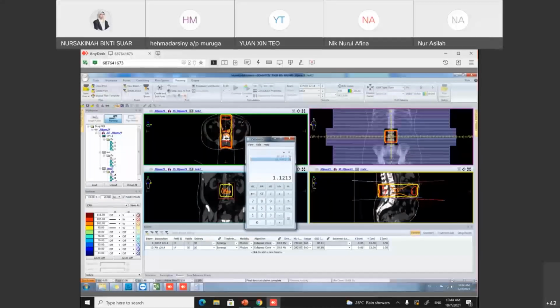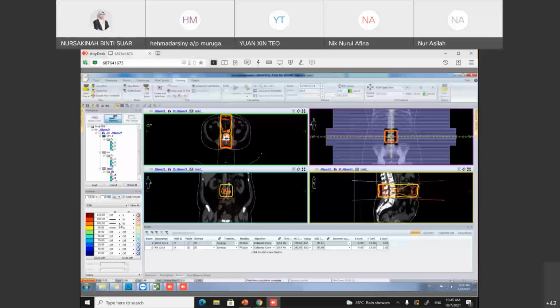Because the prescription dose is only 20 gray in only 5 fractions, the side effect is not of much significance when you compare to the normal radical dose. For this kind of patient, the most they have the chance of is diarrhea, and because you see the higher dose here, 107%, is at the intestine.